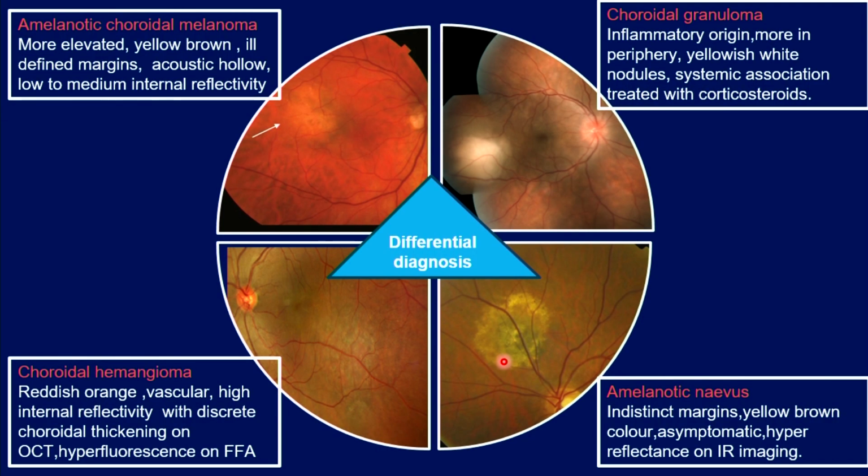This is choroidal osteoma. Do you have any entity called secondary choroidal osteoma also? As a secondary feature, like you have secondary Coats response. Long-standing choroidal diseases can also have this osteoma. What is an osteoma? Osteoma is nothing but a metaplasia, isn't it? Metaplasia can occur in long-standing diseases. Nowadays we also tend to see patients with long-standing choroidal granulomas having these metaplastic transformations.